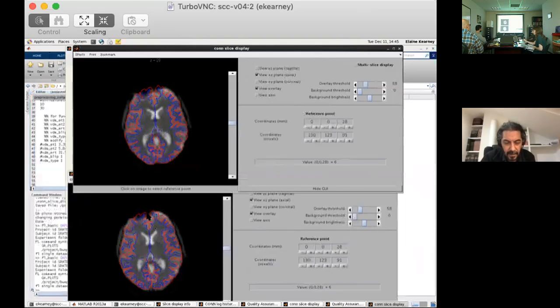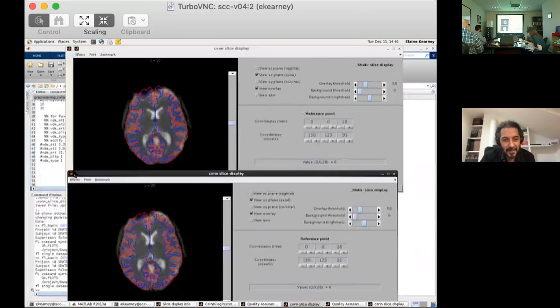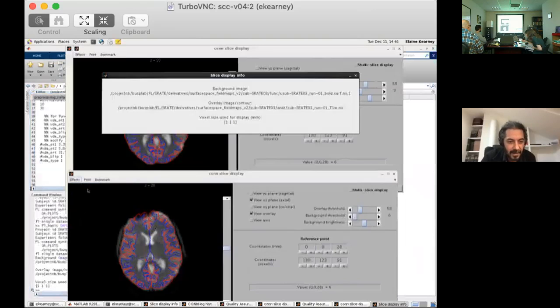But should we confirm that the bottom is actually the... Yeah, that's a good idea. Okay, so yeah, go to the bottom and click on effects and that should tell you basically the name. Yeah, version 2. Okay, so we are happy. So it's that. Okay, so this is one vote for, I think, the opposite. Do you mind checking one thing for me?